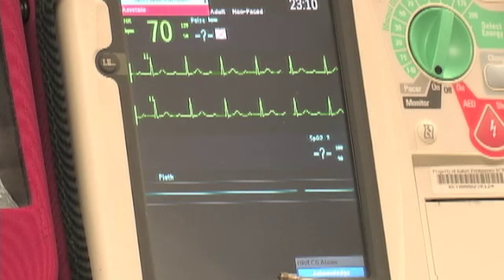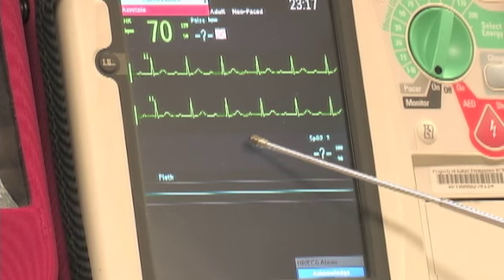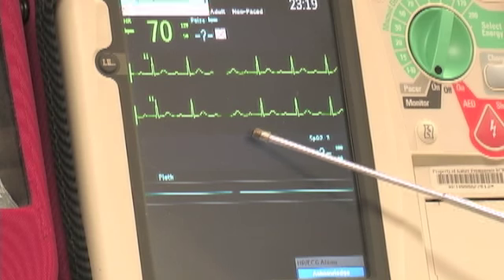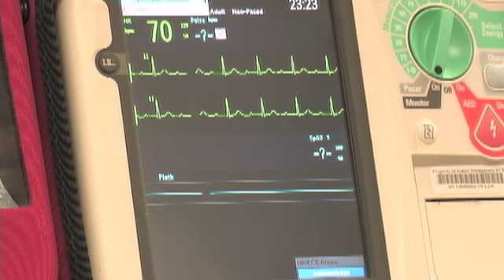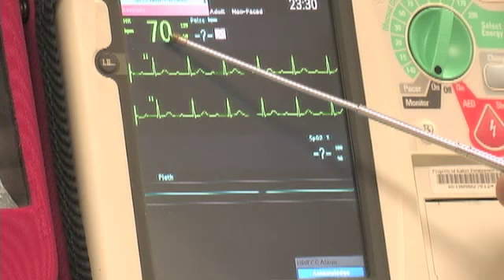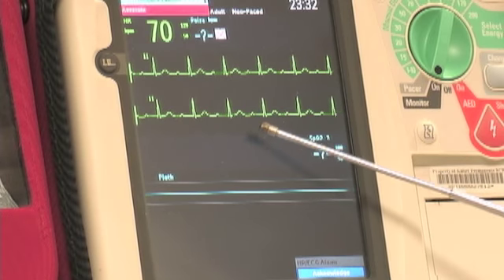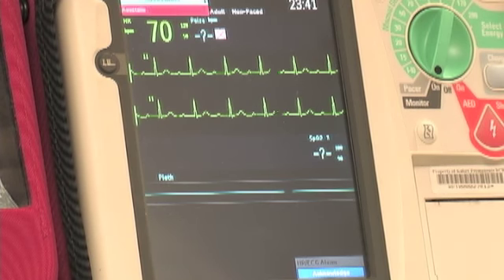First-degree AV block is a fairly benign block. It's not serious, it's not dangerous, but it's something to be aware of, because if a patient is showing a first-degree AV block, they may be proceeding toward further higher advanced blocks, which are more dangerous. Sometimes with this first-degree AV block, the patient is not bradycardic, so just be aware. First-degree AV block, keep an eye on it, and of course with all the bradycardias you're going to ask, is the patient symptomatic or not?